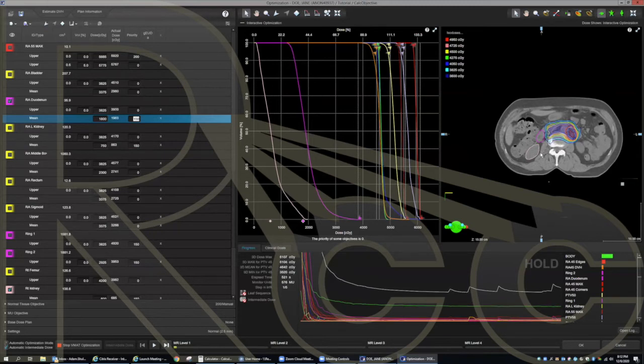I'm mostly trying to just fine tune how the MLCs are going to move, because once you establish them early on, then you start fine tuning more and more and more. By the time you get to level 3, the MLCs are completely set. All you can do is fine tune them a millimeter or so here and there, right? So here's where I want to mostly fix how my MLCs are, fine tune, finished product. That's the idea. And you can see it drops down pretty well.